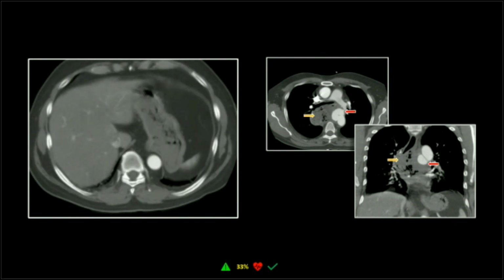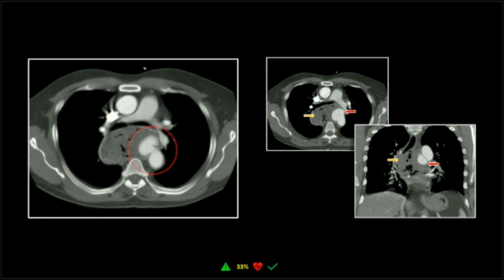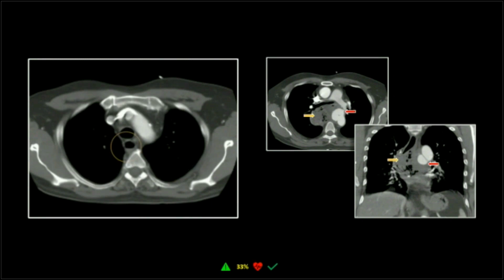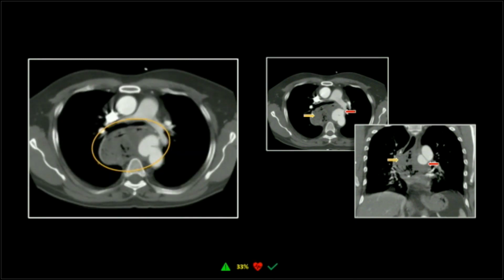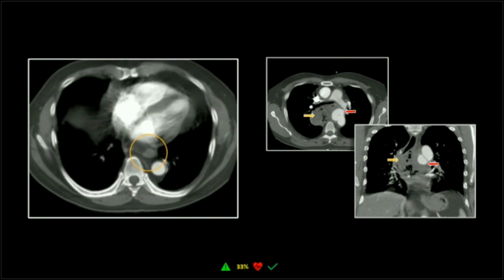So that whole middle section is just macerated and exploded, essentially.